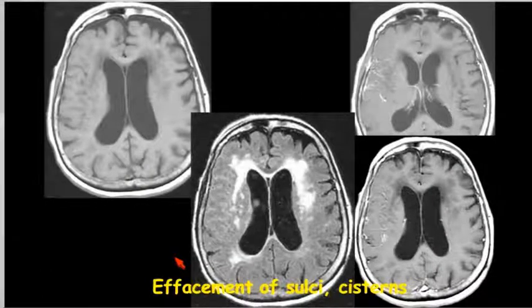Again, a nice example in the Sylvian fissure of focal leptomeningeal enhancement, finger-like extensions along the Sylvian fissure, in this case without too much edema around it. There are certain bugs that like this area. Tuberculosis, for example, loves to start as a little subpial bleb and then rupture into the Sylvian fissure. So depending on the demographics and your local exposure, that may be a strong consideration.